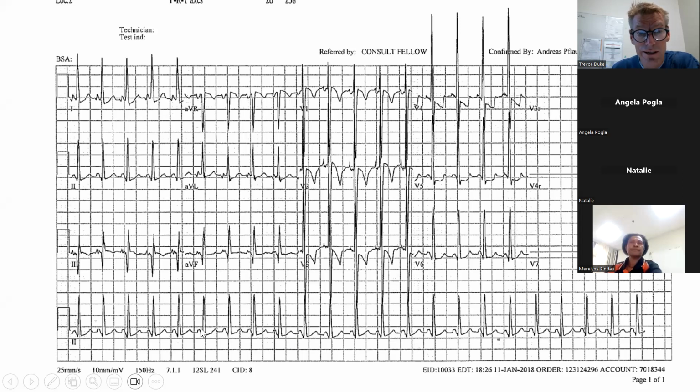And then we should look at the QRS axis in this ECG because it's a bit easy to do. So remember, we said you look at the net deflection in lead 1 and lead aVF. So this net deflection is 5, 10, 15, probably 20 up. There's nothing down, so it's about 20 up.